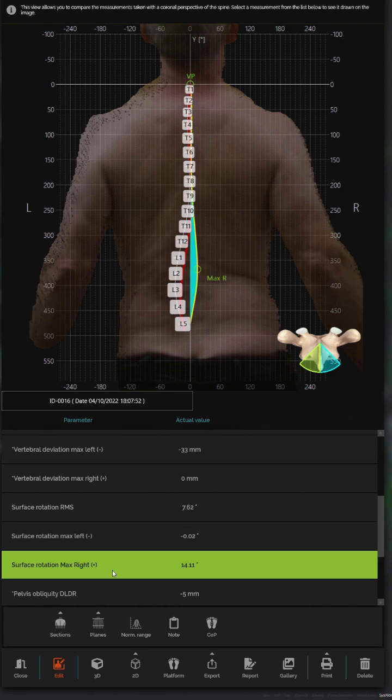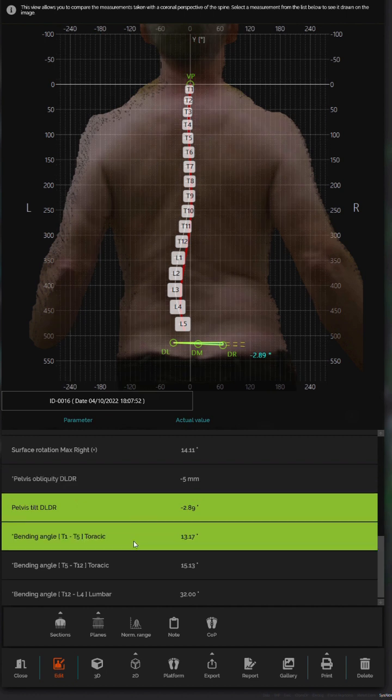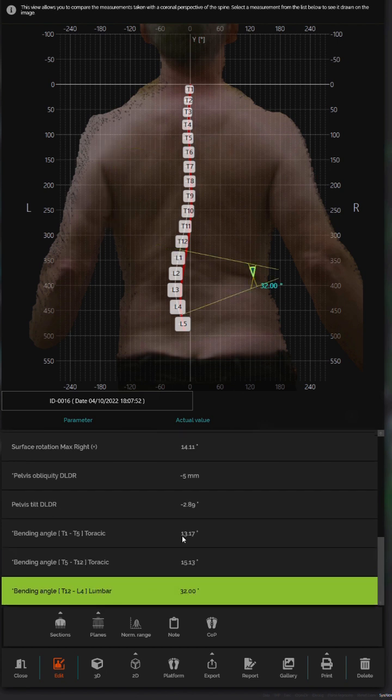This is showing the degree of rotation. It's showing that the spinous process is moving to the right. So that's actually left lumbar rotation, which would actually match common adult de novo degenerative curvature. It's picking up Cobb angles, which are quite mild until we reach this point. It's about 32 degrees. And this was corroborated on X-ray.